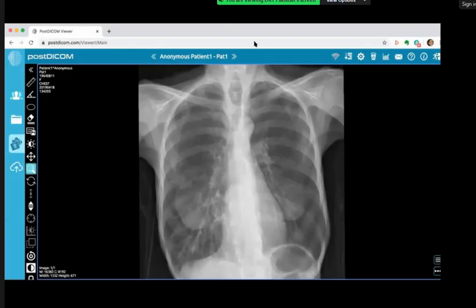So that looks like there is a large nodule, and I'm not sure. It looks like it's connecting to the vascular structure. It has a pedicle to it. She has a history of anorexia, so I'll be concerned about a malignancy. However, given the continuation of the vascular structure, it may also represent an AV malformation. So let's look at her CT.